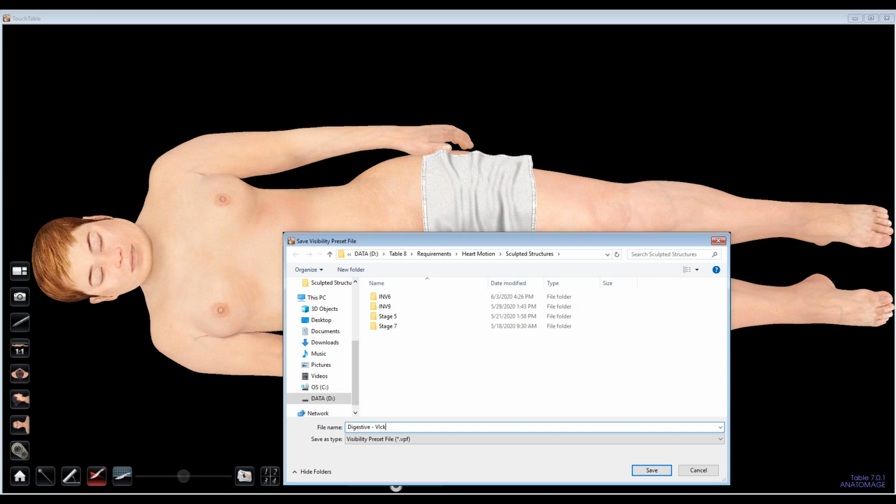We call her Vicky. So make sure you have some way to know, especially when you're in the high resolution data. So maybe in the high resolution data, you're using the female brain. So you'd want to maybe call this brain, female brain. Make sure you know exactly which data set it belongs to.